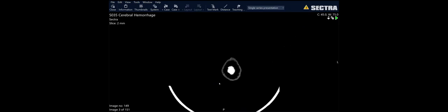All right, so now let's take a look at some pathology. This one isn't going to be terribly subtle. Monitor partition one by one. Show me this. MPR.